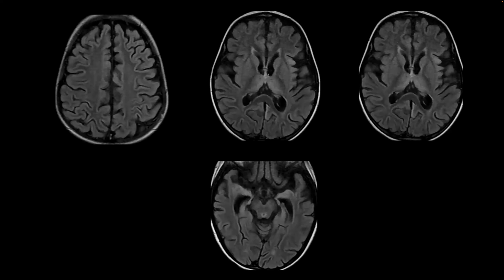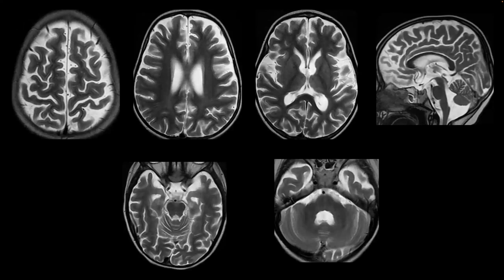Again, on the prior sequences, now we have bilateral bithalamic involvement, more uniform compared to the previous studies. There is a degree of volume loss. Again, on the T2s, you can better appreciate the degree of volume loss, neurodegeneration, and bithalamic hyperintensities.